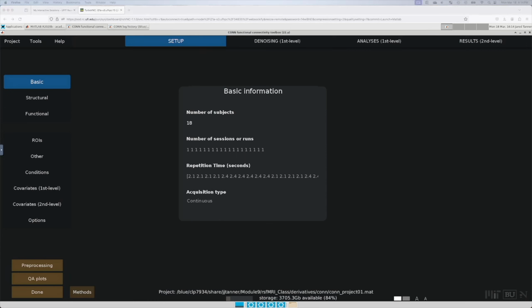So if you want for the homework, you can leave in those 4 participants. I wouldn't really recommend it because it's really going to throw off the data. But these are real data, and this is just a practice analysis, so it doesn't really matter. But this would be the process of taking them out. Sometimes what I would do is I would just go, okay, those 4 were bad. I'm just going to start over, process the 16.